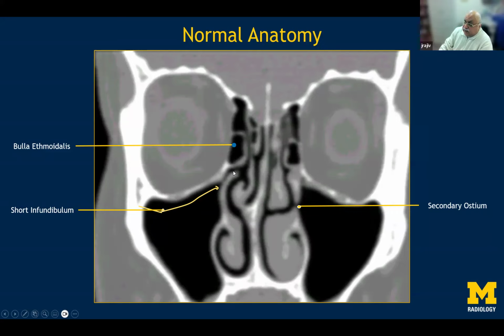So the infundibulum here is very short. If this is the edge of the uncinate process and it's closely approximated to the orbital margin, the chances are that there is no space here to grab this piece of bone to break it. So anything that is being manipulated at this particular level can result in making a hole in the junction between the medial wall and the floor of the orbit. So that is important to always delineate and let the surgeon know about it.